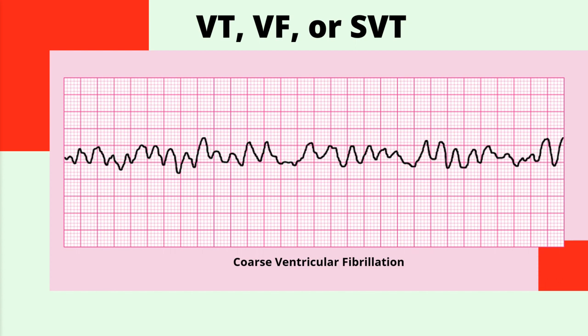Really, when you see it, you'll know that you see it. You shouldn't have to squint and turn your head sideways and say, do I see that twisting ribbon pattern? Chances are you don't. Chances are you do not. VFib is common. It's every day. It's every code. Torsades, you'll be lucky if you see a handful of times in your career.